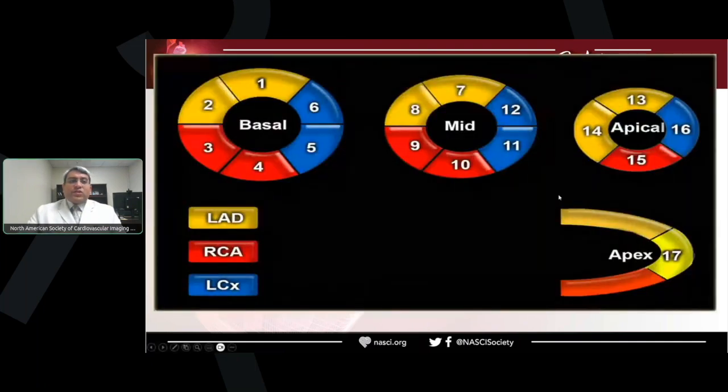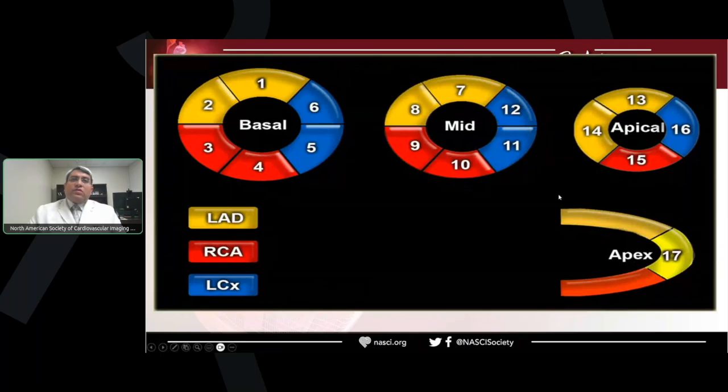You can see here in this literature illustration, important when you say there is enhancement of the myocardium is to relate this enhancement to which part of the myocardial thickness, like subendocardial or mid-myocardial or subepicardial enhancement, and also to localize it to which segment of the myocardium, because different diseases involving the myocardium have different predilection for the enhancement.